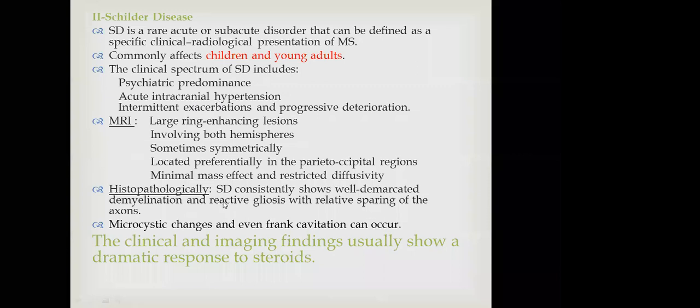effect with restricted diffusivity. On pathology, there will be well-demarcated demyelination and reactive gliosis with relative sparing of the axon. Microcystic change will happen, and even frank cavitation may be seen. The clinical and imaging findings usually show a dramatic response to steroid.